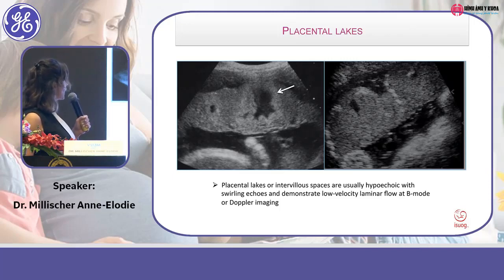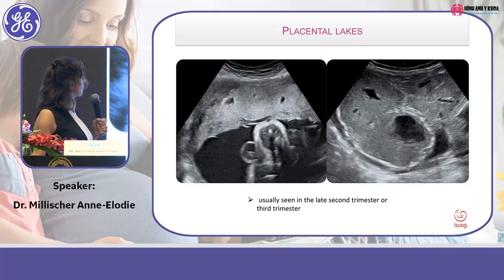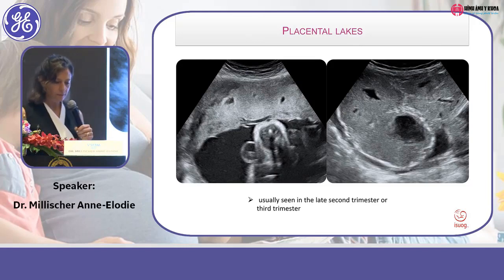a normal lacunae like this is surrounded by hyperechogenic ring, as you can see here, with no Doppler signal inside. Và để các bạn phân biệt đây là một cái hình hồ huyết bình thường á, nó khác với lại một cái hồ huyết ở trong nhau cài, thì đó là nó được viền bởi một cái đường echo dày bên ngoài, và khi các bạn bỏ Doppler vô thì nó thường sẽ không bắt màu.